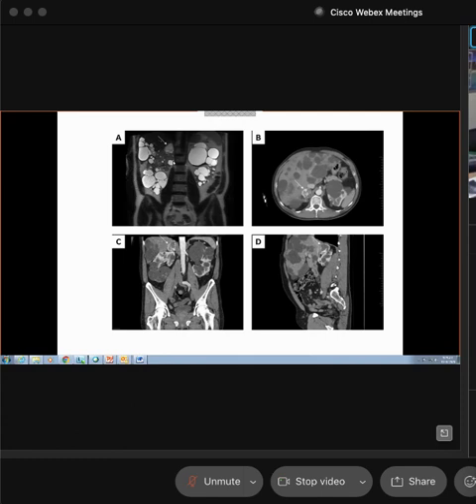So not only did you see that this is a coronal projection, a sliced image, but you were all also able to say which one was at a slice more posterior versus anterior. Make sense? Good. And so how do you prepare for that? Well, you have to know your anatomy. Okay? Now, what kind of projection is B? Type it in.